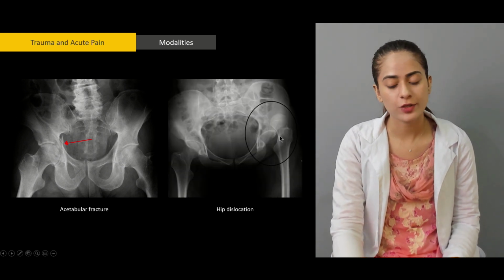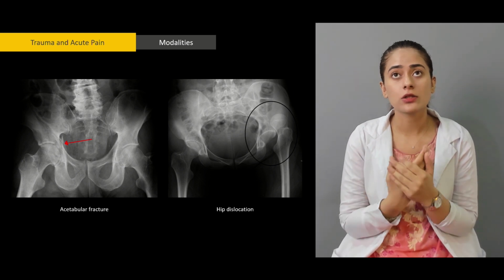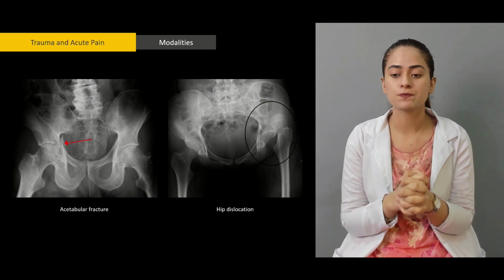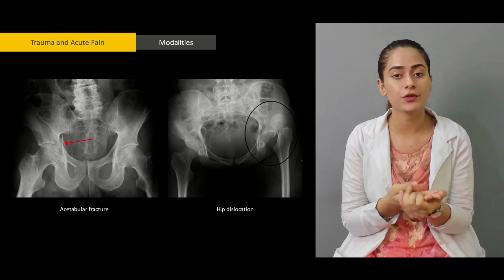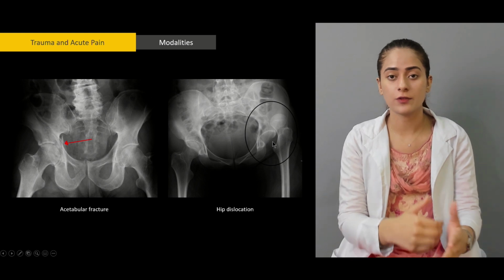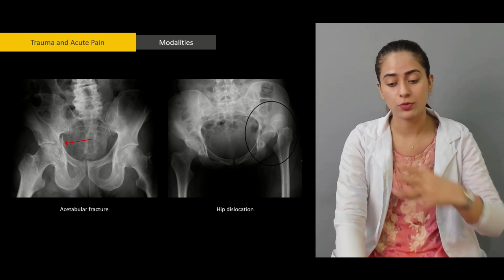And then here we have a hip dislocation. So hip dislocation, let's just actually talk about it a little bit. There's a lot of pull on the femur. There are a lot of muscles in the thigh area, in the hip area, right? So the most common type of dislocation is actually a posterior and a superior one, mostly known as a posterior slip or posterior displacement. So what happens is when the femur is posteriorly displaced, it is also moved superiorly a little bit, like I said, because of the push of the muscles, actually, or the pull of the muscles.